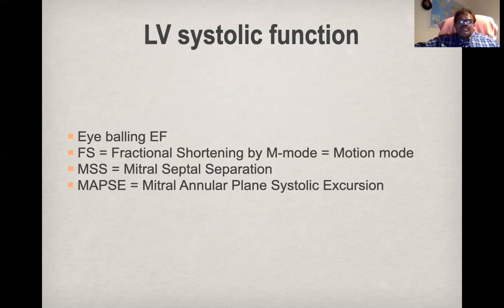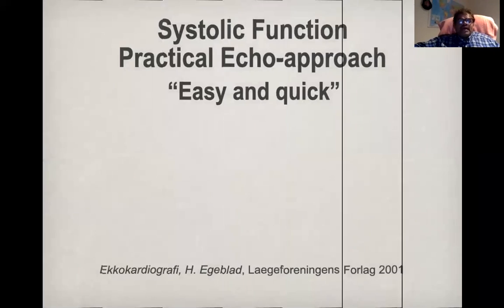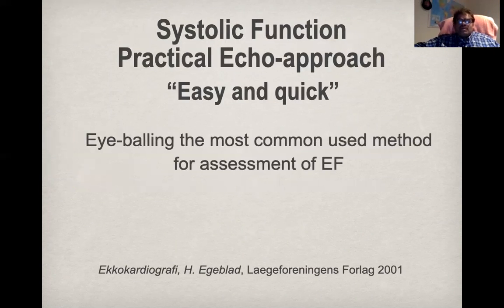MAPSE, you must have read it in our module. MAPSE is mitral annular plane systolic excursion, where you measure the movement of the mitral annular plane during systole. Let us see how we use all these methods.